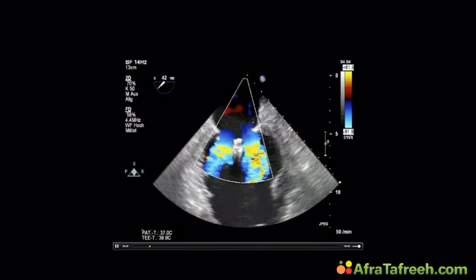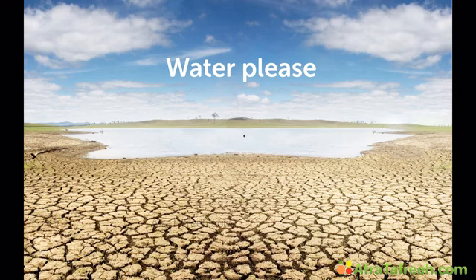So in essence, you see that 3D is a real neat thing, and I think if you look at the morphology of the mitral valve, it does help you, especially in situations where you're planning surgery or where you're trying to understand what the extent of a lesion is. But again, remember, I think it should always be looked at in conjunction with conventional echo, with transthoracic, but also with TEE. Good. Okay, so this was a little mini lecture.